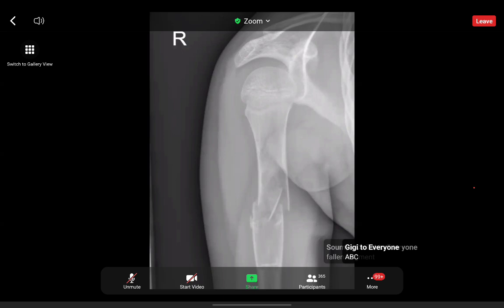No is the answer. Sometimes in medicine, never say never, but certainly in terms of the exam, this cannot possibly be anything else. It's pathognomonic. So we've got a fallen fragment sign here, a fragment of the pathological fracture lying dependently within the cystic change.